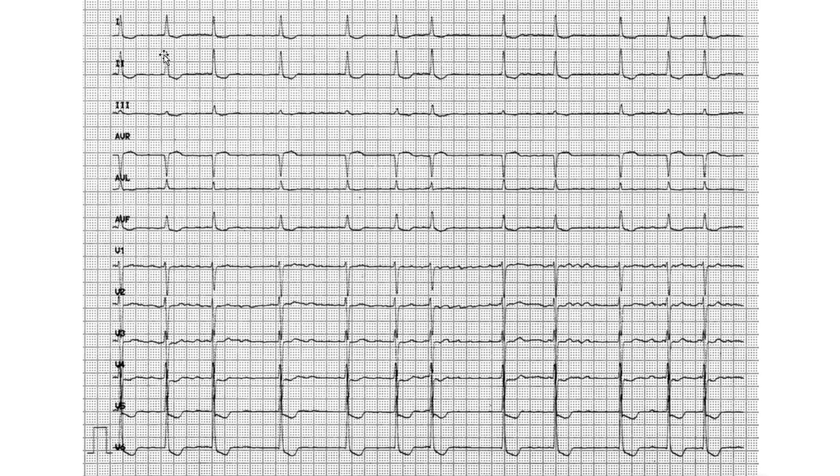This is clearly irregular. P waves? I don't see P waves. And in V1, this is fibrillation. Instantly you can tell there's some fibrillation going on here. So that's going to be 4.